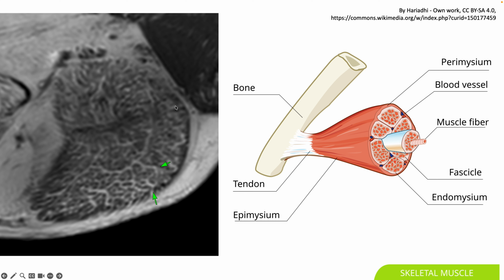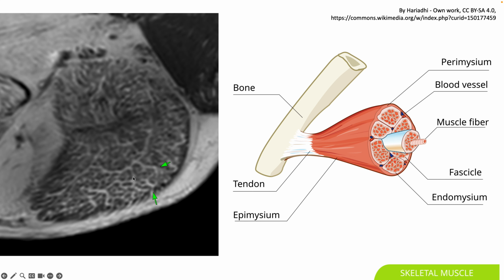And the epimysium would be all along the fascia here. So it's interesting because when we see the honeycomb pattern, we're outlining the perimysium, and my feeling is that when you're seeing signal in the individual muscle fascicles, I guess there is involvement of the endomysium as well.